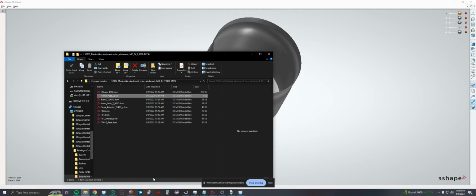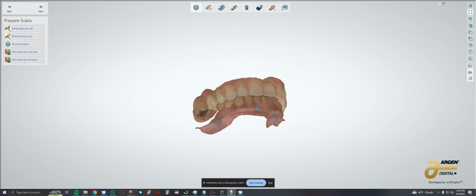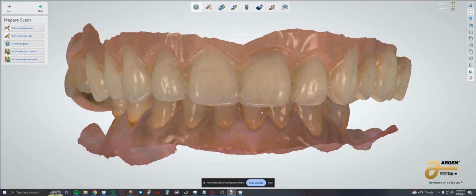So you go ahead. We're going to go back into our folder here. And we're going to grab this T81 analog file here, copy, name it original, go to this one, name it analog, and then we're going to right click on the model, go build model. It's going to open up the model builder. There it is. And then we're just going to run through.